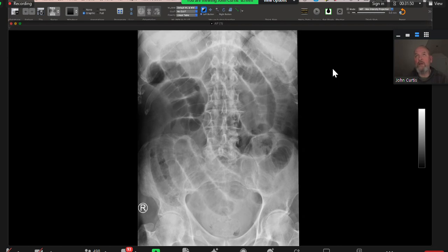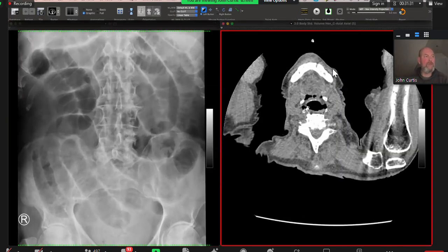Anything else? Would you go on and do a CT? Yeah. So let's show you the CT. Oops, wrong one. Sorry.